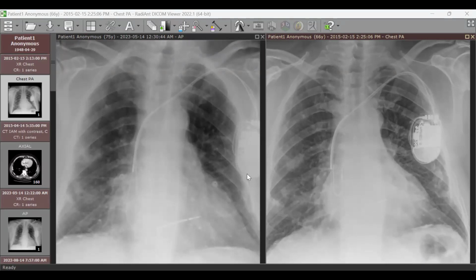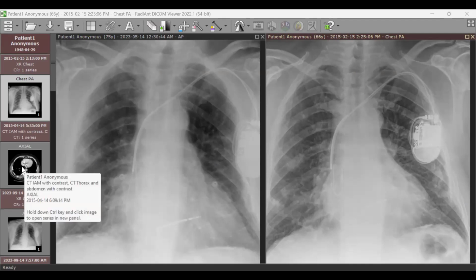ICD leads. So throughout these 8 years, the calcified pleural plaques have enlarged, right? Yes. And you can see here also projected over the right lung and here. So they have enlarged. Nothing changed for the ICD. Now let's go. So they requested a CT chest to see what's happening with this patient.